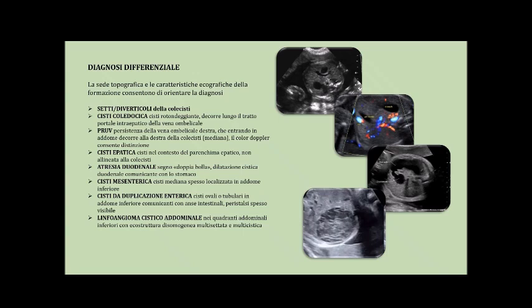There are also cases of cystic abdominal lymphangioma, which is a lesion that affects the lower abdominal regions. It presents a characteristic echostructure, usually large with a multicystic, multiseptated appearance, resulting in a more heterogeneous echostructure, very different from a classic cyst and typical gallbladder duplication.